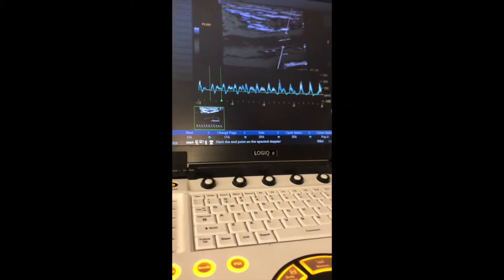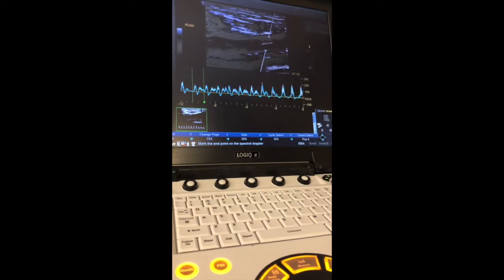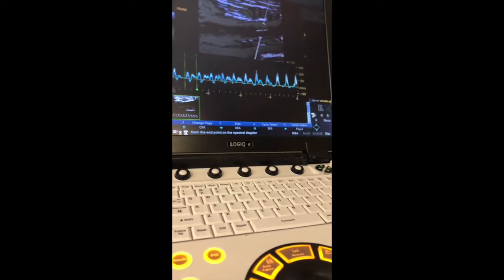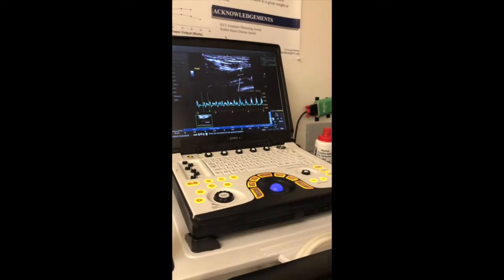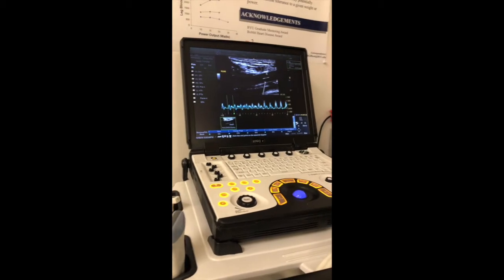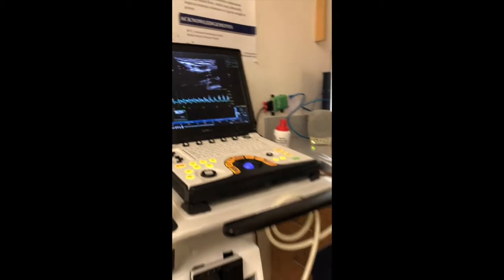There's no need to do diameter measurements for anything besides baseline. The baseline measures will be used for the rest of the PLM analysis, and that is our ultrasound analysis.